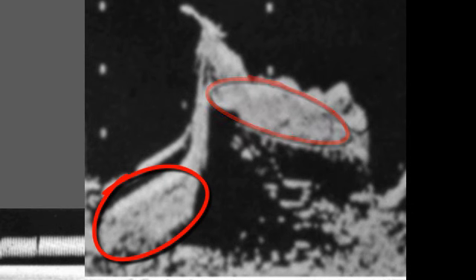Look at this aspect, like a cotton or a cloud. You see no lines. Look at the torn paper border. This is a classical aspect on M-mode. This aspect doesn't happen in a calcified or just thickened valve with no vegetation, unless there are also vegetations.